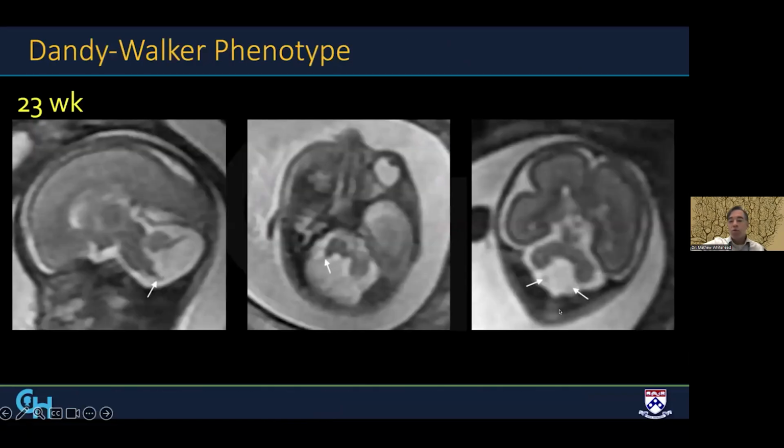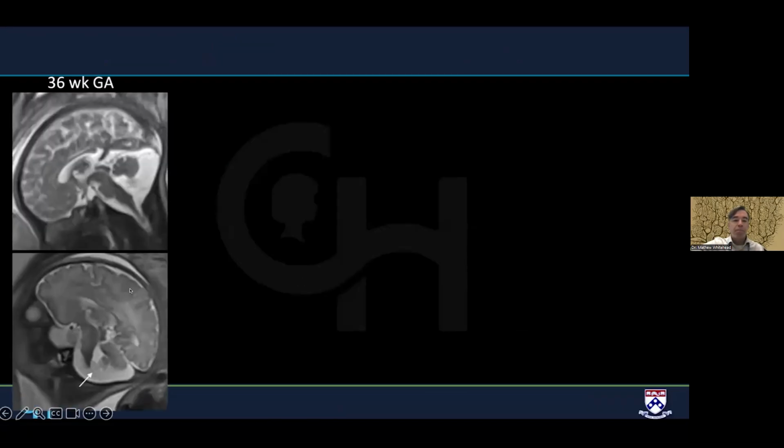So you should have no trouble recognizing this as a Dandy-Walker phenotype. It's a pretty straightforward case. We see inferior vermian hypoplasia, a flat fastigial recess, tegmental vermian angle elevation, this tail of tissue inferiorly, and if you look closely, this thickened, infralaterally displaced tela choroidea and choroid plexus. But what about this case?